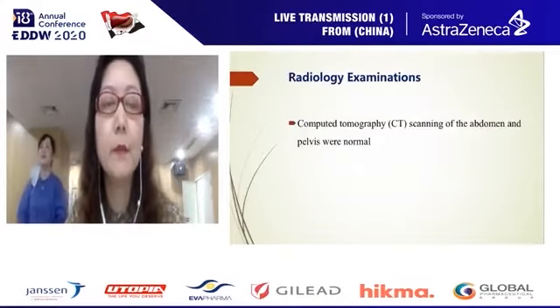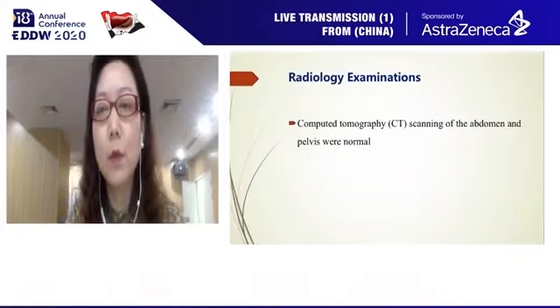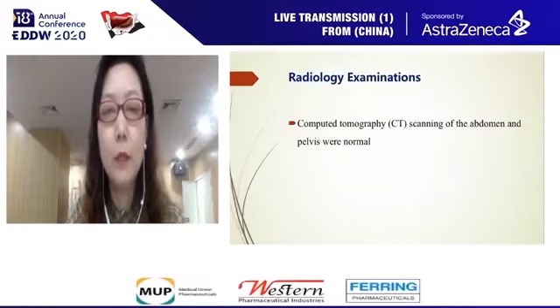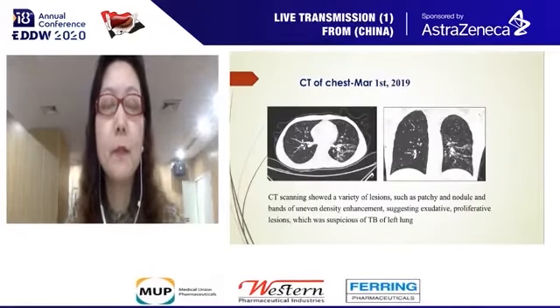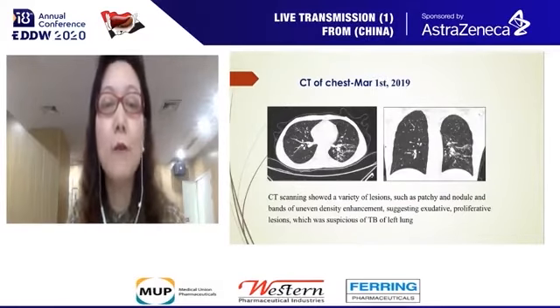And here is the radiology examination. The CT scan of the abdomen and the pelvis were normal. And here is CT of chest. And the CT scan of lung showed a variety of lesions.